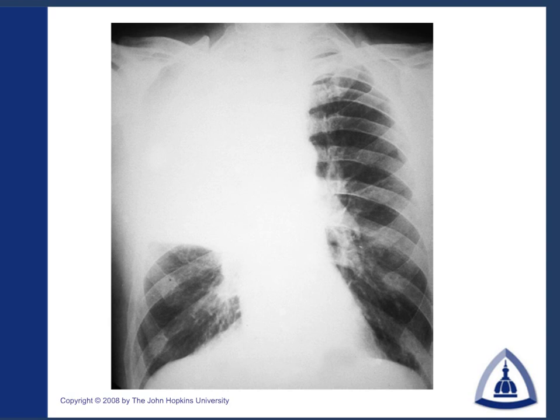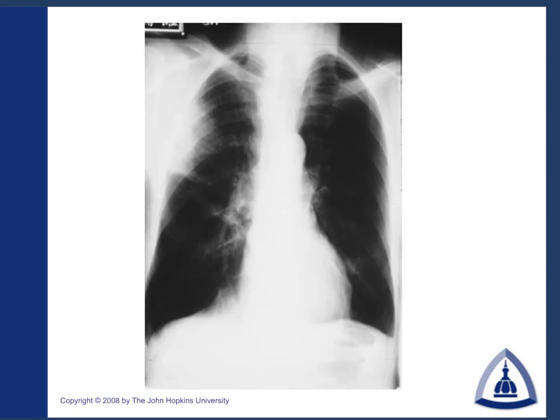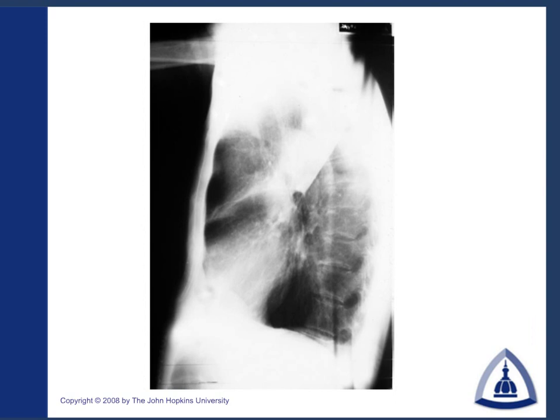Okay, this patient again presented with several weeks of cough, sputum production, fever. This chest x-ray shows this right upper lobe infiltrate. We see an air bronchogram going through there. Okay. We know there are 3 segments of the right upper lobe, and this just happens to be a posterior segment of the right upper lobe pneumonia, okay, in a patient with cough, fever, and sputum.